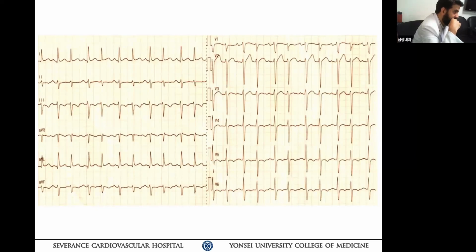As our colleagues already mentioned, I think the sinus rhythm with the junctional rhythm, like the group beat, is the most possible. Maybe AV node or 1 to 2 conduction may be possible, but I'm not sure. 1 to 2 conduction? Maybe, but more likely with junctional rhythm. Junctional bigeminy, I think. Junctional bigeminy. Yeah.